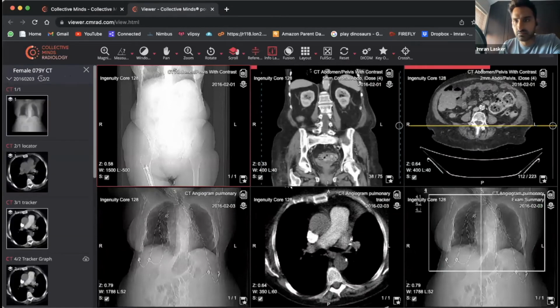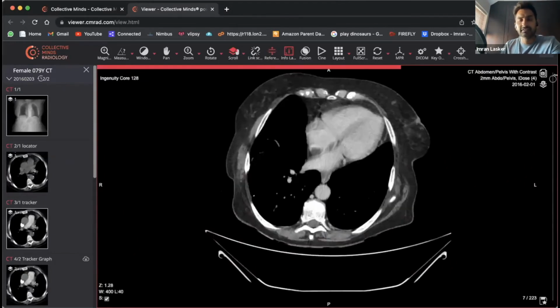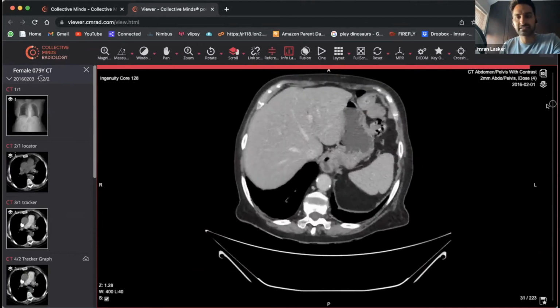Okay, so we are now looking at, let's do this one. Go from the top. So again, it's abdominal pain. Let's think about what phase of image this is. Okay, so we're coming down, we've got a small hiatal hernia. A bit of hiatal hernia, but probably not causing abdominal pain. It doesn't look like it's compromised in any way, and most of the stomach is actually sitting below it.